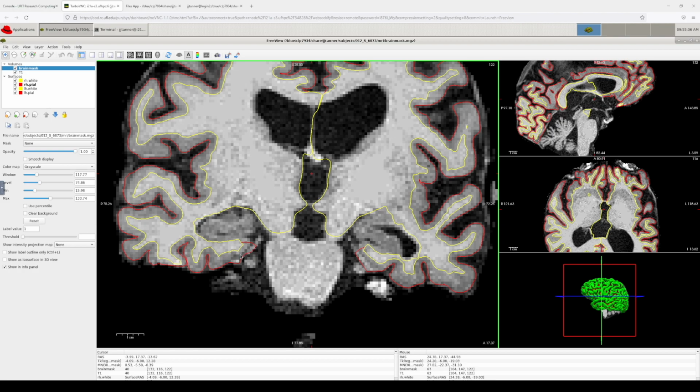But on a lot of the MRI, FreeSurfer tends to pick up dura mater right by it. That's not surprising. They all look about the same, the intensity, but it's technically an error. And so that's an area that could be cleaned up.